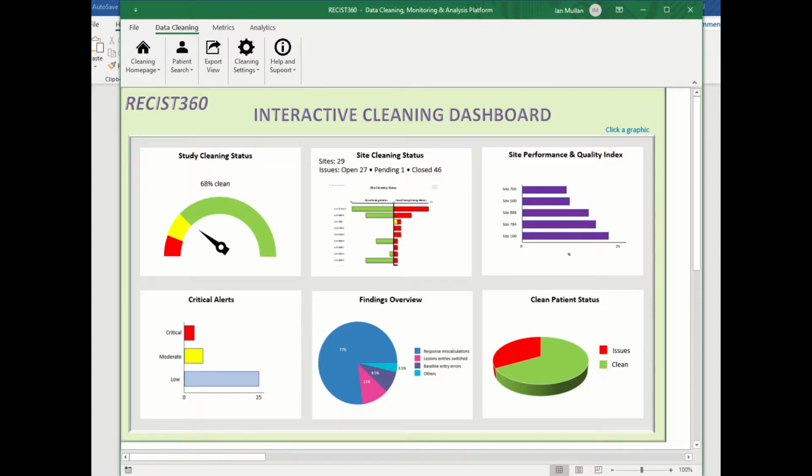Hello, this video has been made to keep you up to date with the progress of a fully automated RECIST data review and monitoring tool. This is presented now especially given the data cleaning features are now developed. The fully developed tool is due for release later this year.